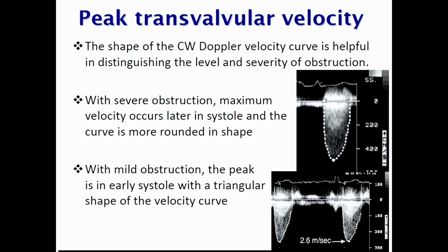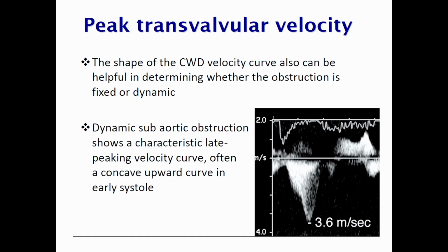Even looking at that, especially after replacement of the aortic valve, looking at the velocity curves you can say whether this patient will have a patient-prosthesis mismatch or not, depending on the early peak systolic velocity of that particular jet. Whichever way you try to quantify with numbers, looking at the image can also give you a good quantification, but obviously you need to look from that perspective and not always from the number side of quantification.